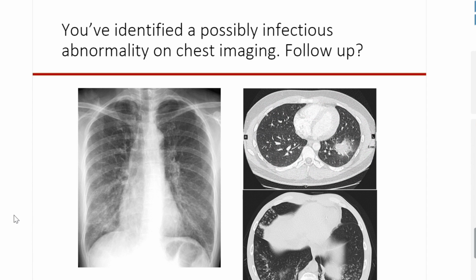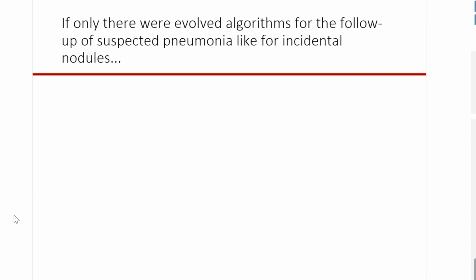This patient was actually from Texas, all right? And I don't think most of us would know that this is actually blastomycosis, all right? It was read out as aspiration, which I see why, all right? But the patient's home state really gave away what it was.